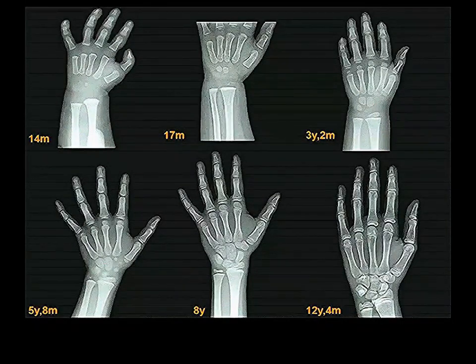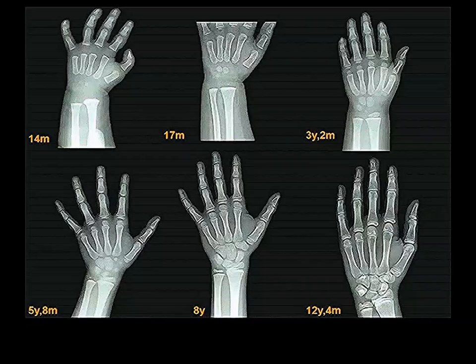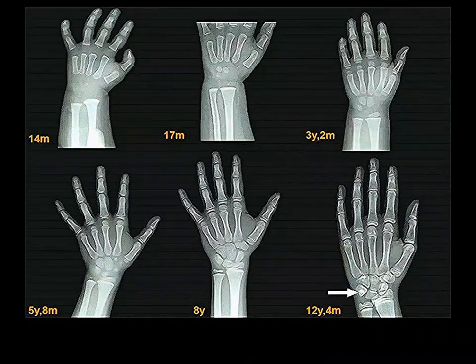In terms of our wrist bones, we have hamate, capitate. Now we start to see the triquetrum come in. And distal epiphysis for the radius. What must this be? This must be lunate, would be my guess. It is. Here's lunate, triquetrum, hamate, capitate, trapezoid, trapezium, and now the scaphoid is there as well. And then we get to where it looks by 8 years pretty much like an adult. The last one to come in is the pisiform, which is right here. That's the last of the carpal bones to ossify.